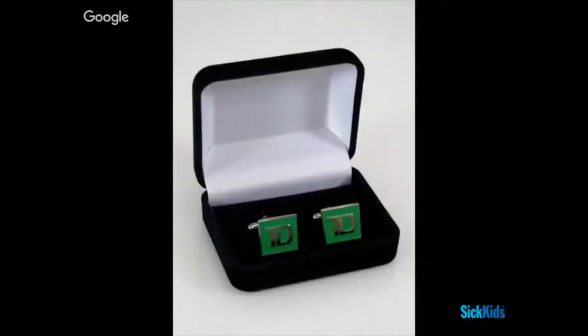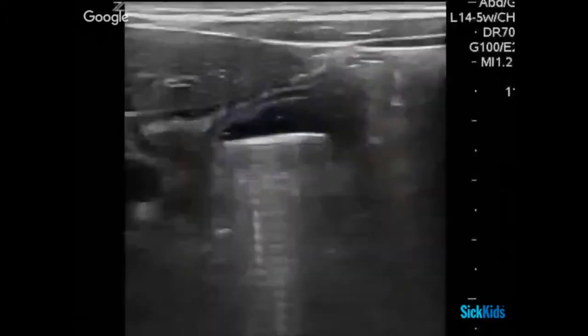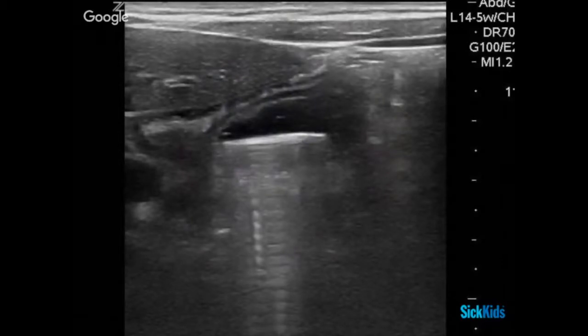When we talk about foreign bodies lower down, we had a patient who ingested one of these pins, and here you can see it located in the stomach. So remember, you can use ultrasound to look for some foreign bodies deeper down, but it's very difficult in the thoracic cavity itself to determine things. Once it gets to the stomach, if you have some fluid there, you can do similar techniques to assessment of pyloric stenosis to try and take a look at some of those foreign bodies. But again, with a radio-opaque foreign body, it may be more worthwhile to just do an X-ray.